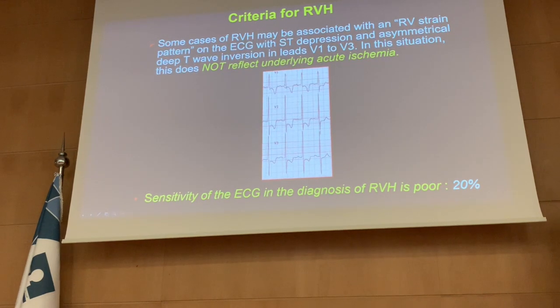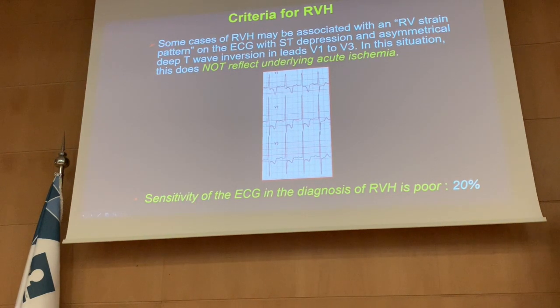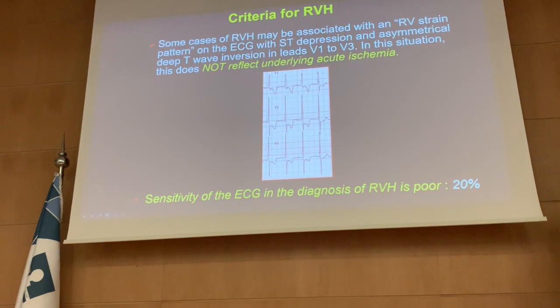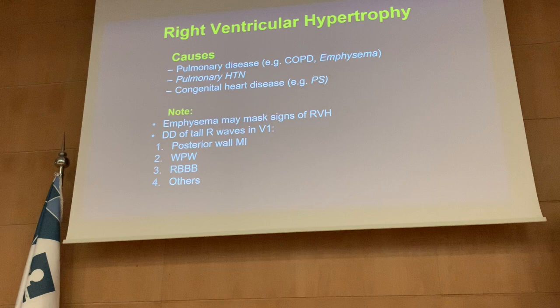So this patient, a young lady, has progressive shortness of breath, pulmonary hypertension, and she has this ECG. Do you have any doubt that this patient has right ventricular hypertrophy? She has a big R wave in V1, it cannot be this big normally. And she also has ST segment changes. This follows right ventricular hypertrophy. Okay, so we're going to do an echo.